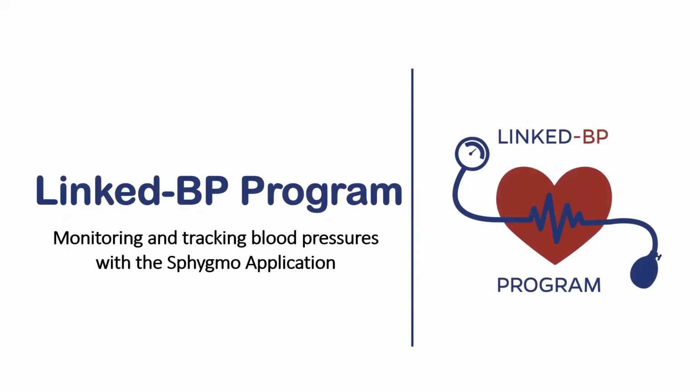A big part of this program is taking your blood pressure and keeping track of it. In this video, you'll learn how to use the Sphygmo app to keep track of your blood pressure readings.